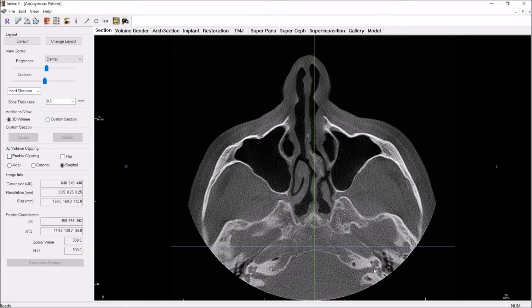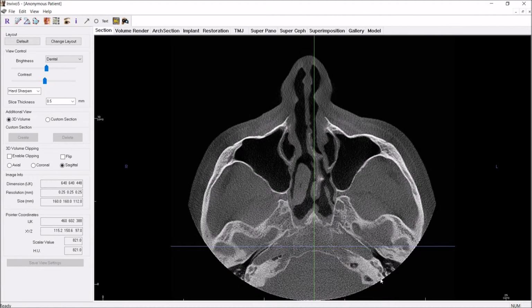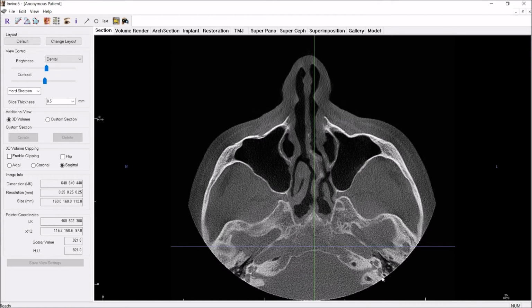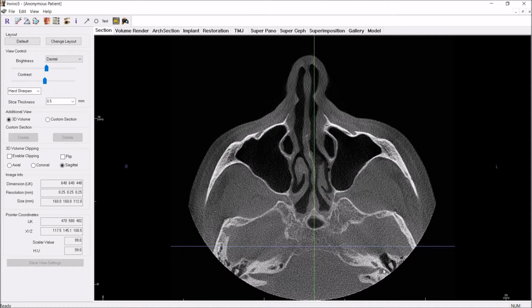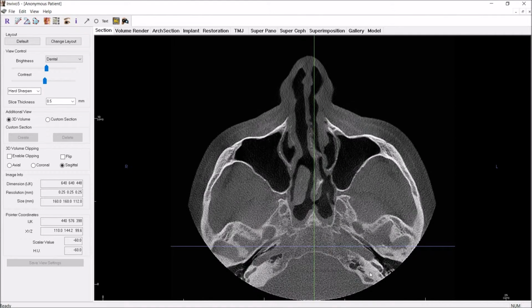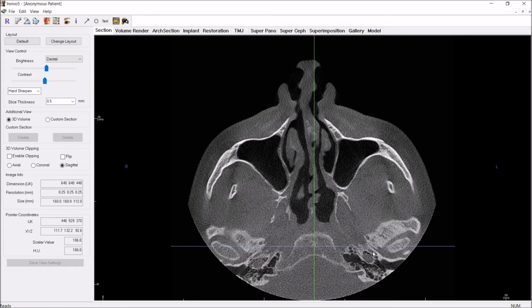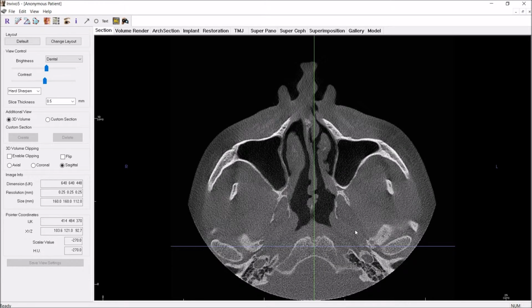Let's scroll through that a little bit. And posteriorly and attached to the vestibule, you see the semicircular canals. This doesn't show all of them. But you just want to look at each of these areas, make sure things look well defined, that they have corticated borders, that you don't have some additional hypodensity that doesn't belong, or swelling. Everything looks normal. And then we get a little extension of air anterior medially. And if you follow that, that kind of extends through a canal. This is just the Eustachian canal, the posterior part of which is a bony canal and the anterior part of which is cartilaginous.